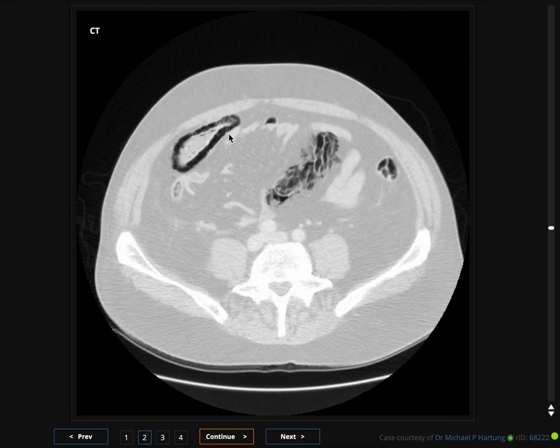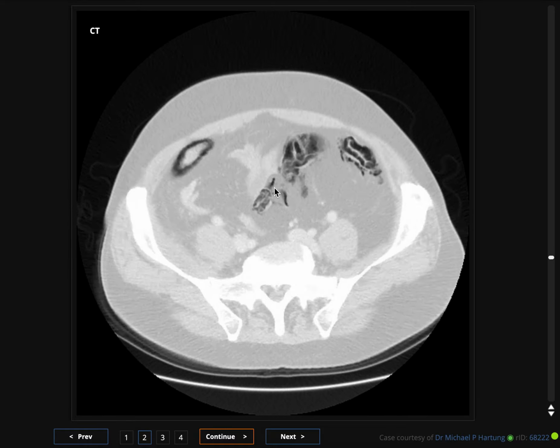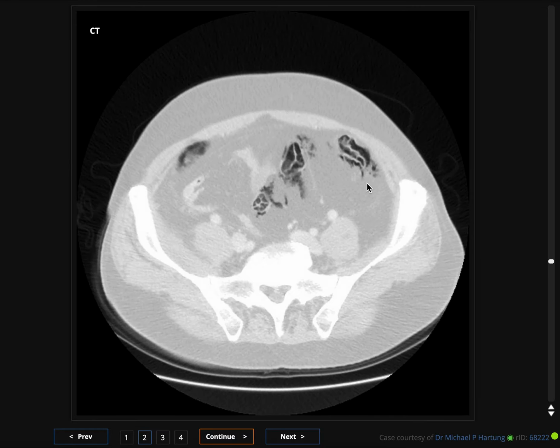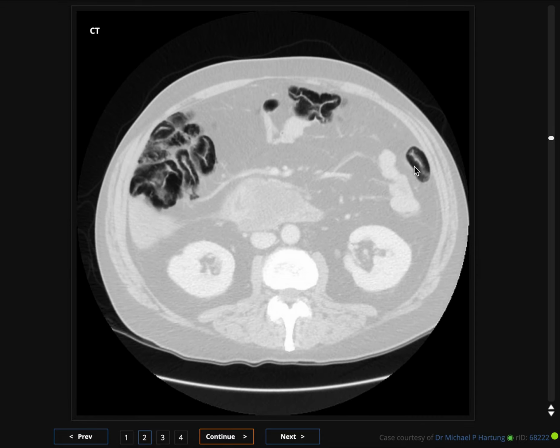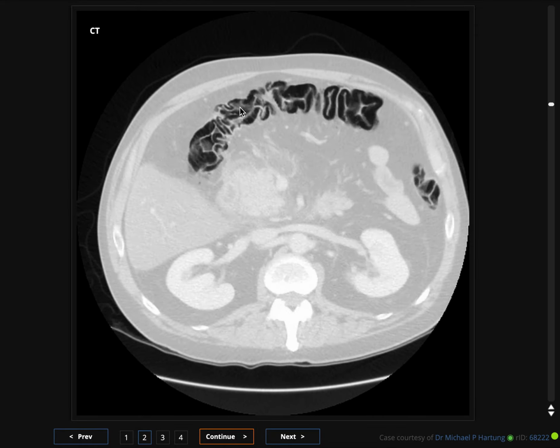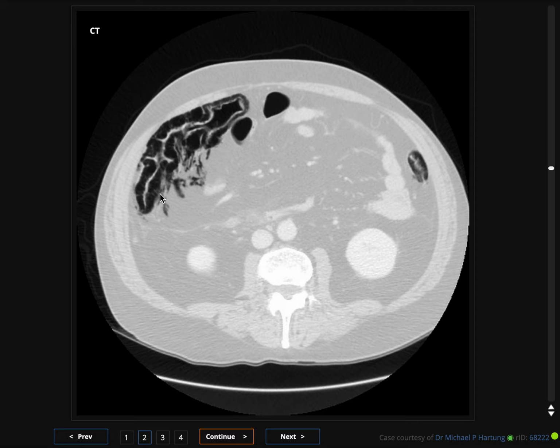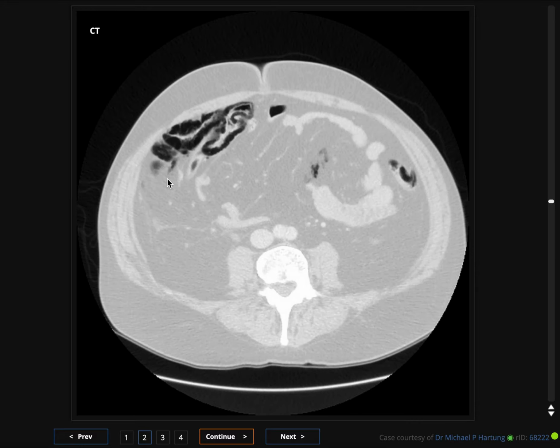We have lung window. Let's just go to lung windows. Here we see a really good case of pneumatosis. So there's air outlining the rectum here, sigmoid colon here, and as I go more around the descending colon. So there's pneumatosis completely around the wall of the colon. Here's transverse colon, ascending colon here. There may be tiny locules of free air around, but mainly it's pneumatosis.